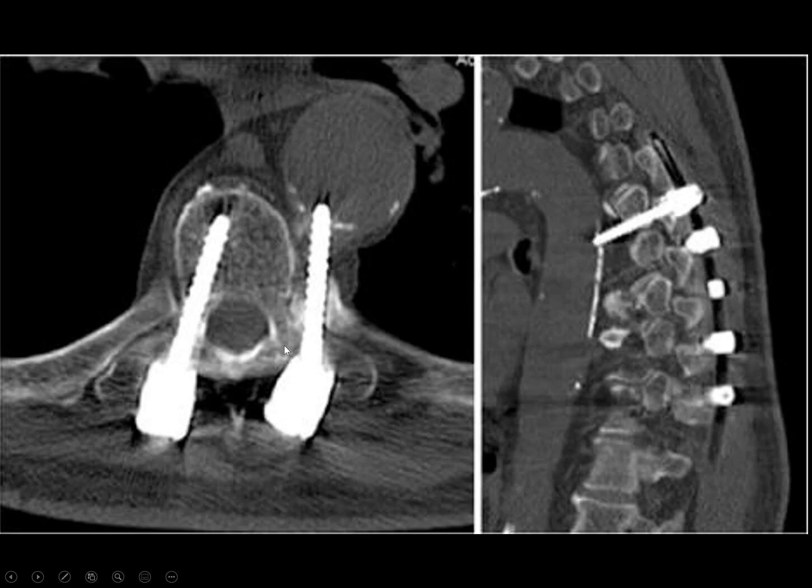And one way to avoid this is on the left, especially if there's an aorta close to the spine, you always make your left screws kind of short. You see that? So, I usually, you don't need a long screw. If there's any question, I just make the screws at the 50-yard line of the vertebral body. You see, this is the front, this is the back. So if you kept it at halfway on the left, you're never going to hit the aorta. So that's kind of like a rule of thumb over time that I've used in the past.